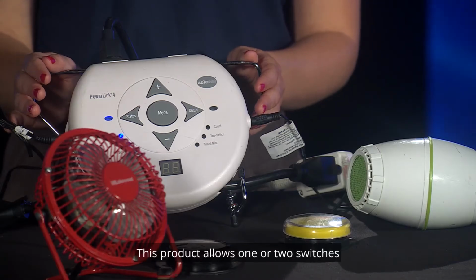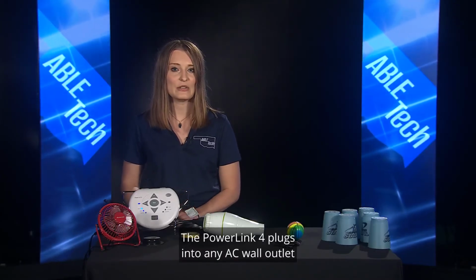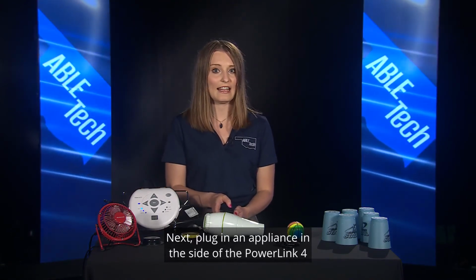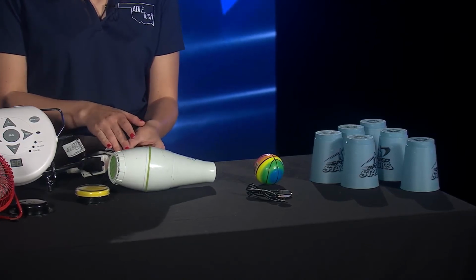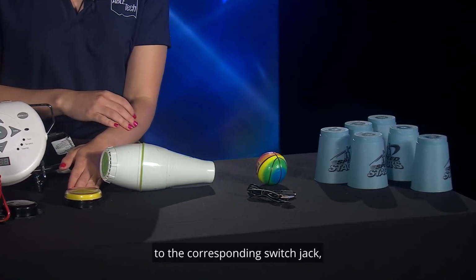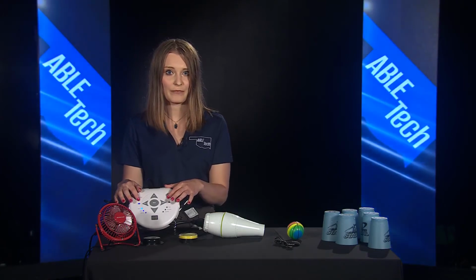This product allows one or two switches to turn an electrical machine on or off for various durations. The PowerLink 4 plugs into any AC wall outlet with a provided cord. Turn on the device. Next, plug in an appliance in the side of the PowerLink 4 and turn the appliance on. Attach a single corded switch to the corresponding switch jack. Then select a mode of operation.